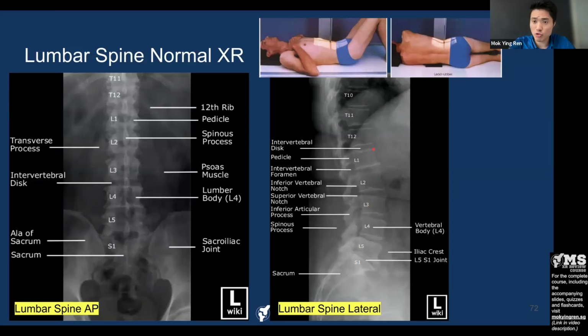And the opposite can be true. You can have a lumbarized S1, meaning part of the sacrum now appears to be separate. And now you think it is an L5, but it actually is an S1, right? So in essence, a lumbarized sacrum may make you count wrongly, and a sacralized L5 can also make you count wrongly. So therefore, honestly, the gold standard is really counting from the cervical spine, C2 onwards, downwards.